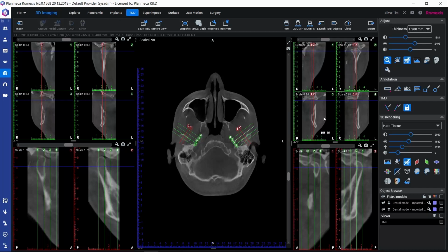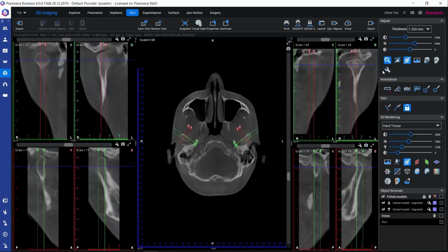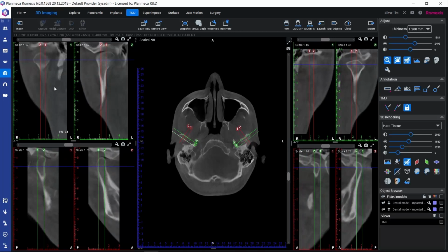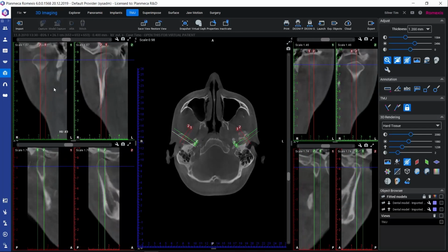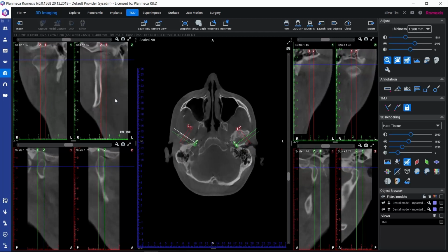And like we see, it gets updated automatically here on the other side as well. Then finally, we could also use this move rotate volume in order to adjust the exact positioning of data on these views. So we could just simply grab the volume and move it around, and we could also rotate the volume with our right mouse button down.